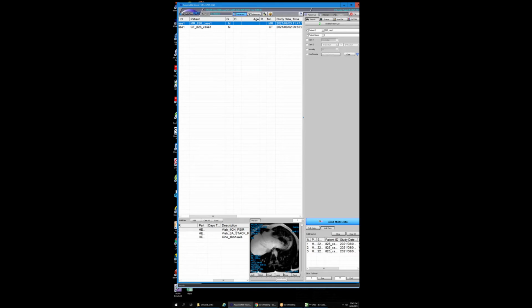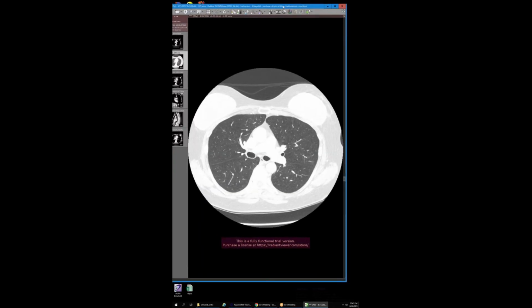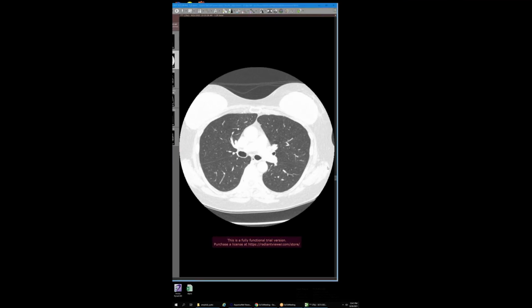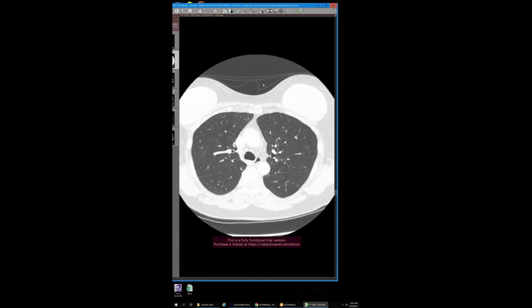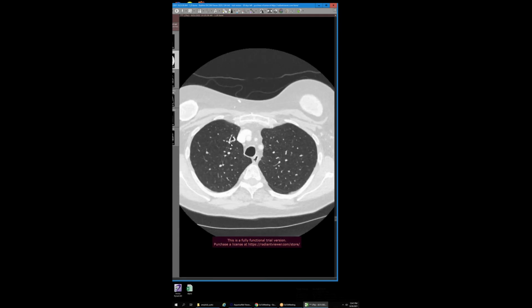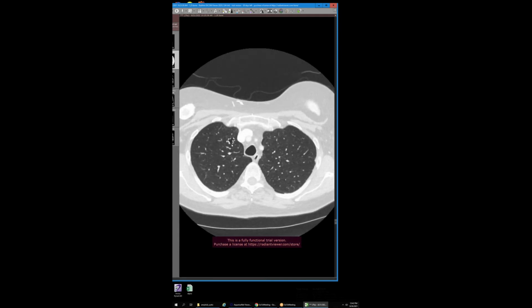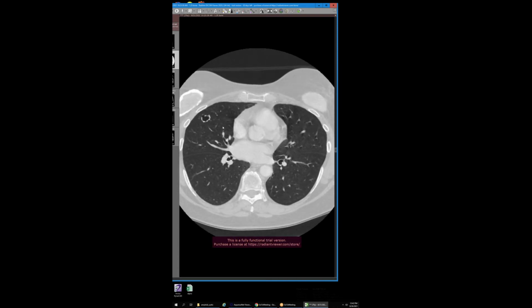And then last, this is interesting. I want to know if any of you had seen this. I think I've seen this before in a few cases with amyloid, but I was wondering, this patient has gastric amyloid and has all of these cystic areas, and we know we've seen cystic lung disease with amyloid, but these cysts have that kind of bubbly calcification, those profound calcifications, and we've all seen those very heavily calcified nodules with amyloid.